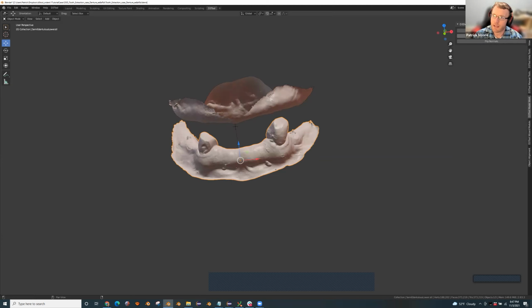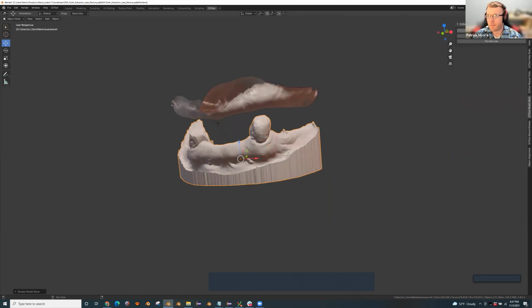So that's just a little aside: we've got a little safety built in to keep things functional. Now I'm going to add a simple base to this model. There's no need to add a land to this, but I will allow for cleaning and filling of holes. So that's going to add just a nice base here. I'm going to go back into the trim tool.